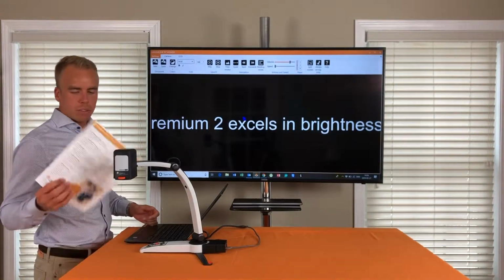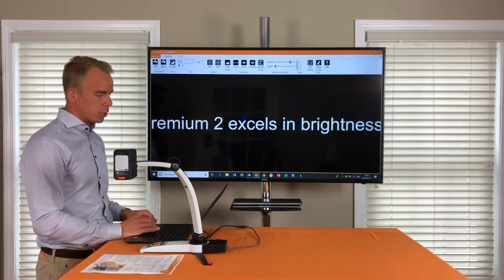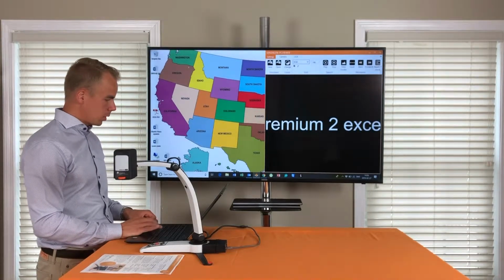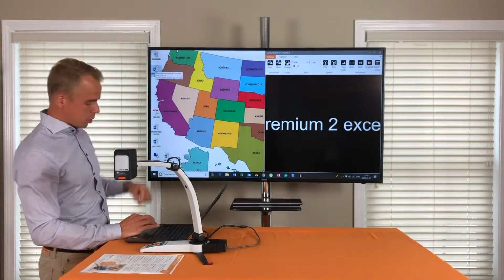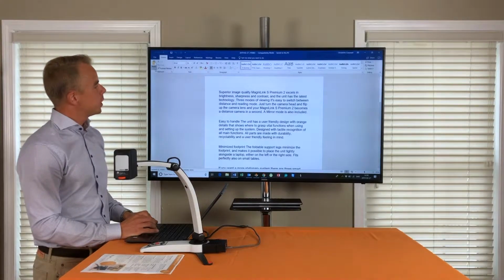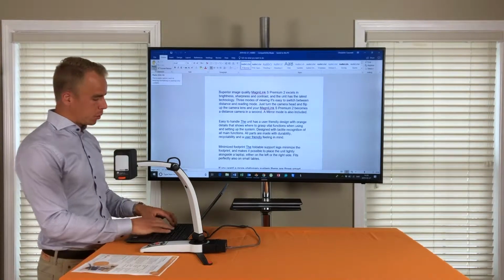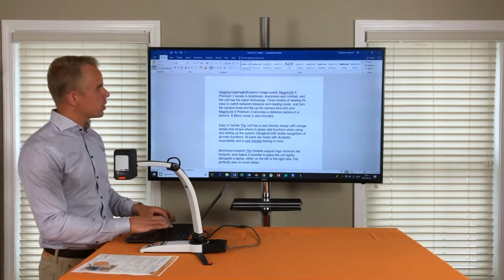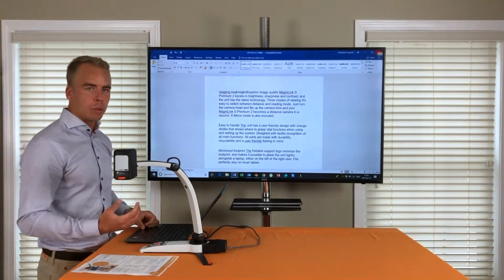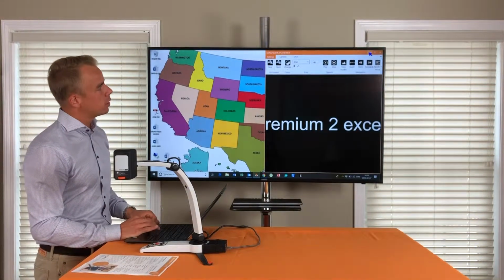So now we save this whole text into a Word document that I can open up, which I will show you. It's over here on my desktop. And here it is. So now I have this text as a Word document saved on my computer where I can now go in and make any changes, which will help me to be more productive with my homework or with documentation overall in general.